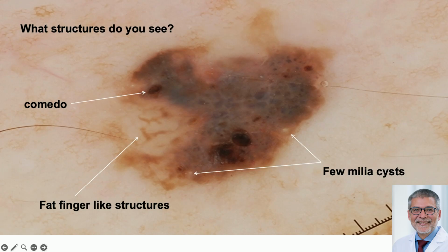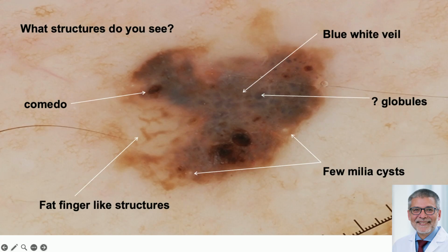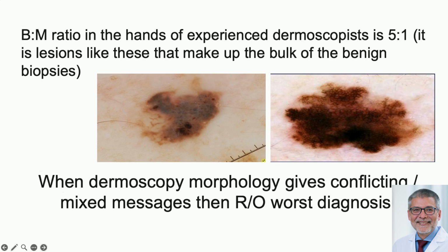And so, you will see when we talk about melanoma that these are sort of overlapping features with melanoma as well. And so this is a lesion that ended up getting biopsied, but it ended up being a seborrheic keratosis. It's okay. So that was the seborrheic keratosis, and it's a reminder that no matter how good you get, no matter how many technologies you put at it, no matter what other test you apply, you will always have some benign to malignant ratio. You will never be 100% correct. And I just highlight two lesions, one that was biopsied was seborrheic keratosis, one that was biopsied that was a benign nevus, but on dermoscopy, impossible to tell apart, and you're basically committed to a biopsy.